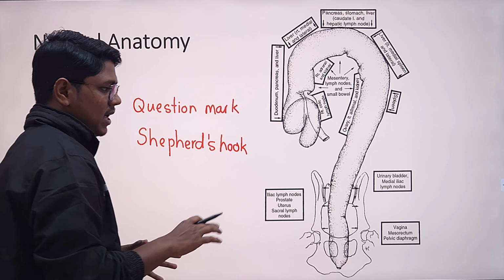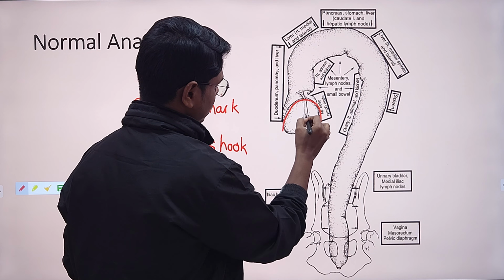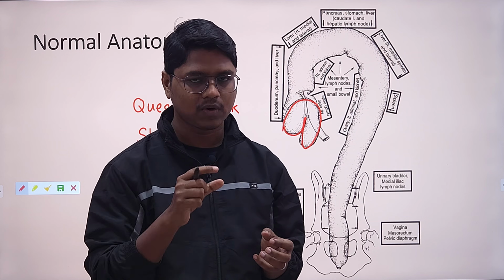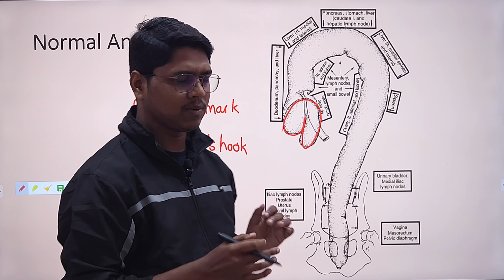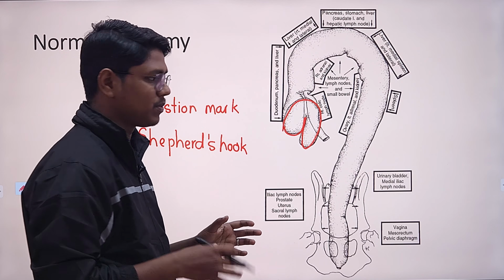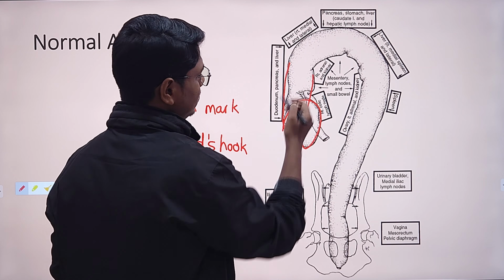The large intestine has different parts. This is the cecum. This C-shaped structure is the cecum. This is of a dog. In the case of a cat, the shape is actually very short and cone shaped. They are not radiographically visible in the cat. I have already discussed this in the normal abdomen lecture. In the dog, it is visible in the radiograph. And after the cecum, the ascending colon.